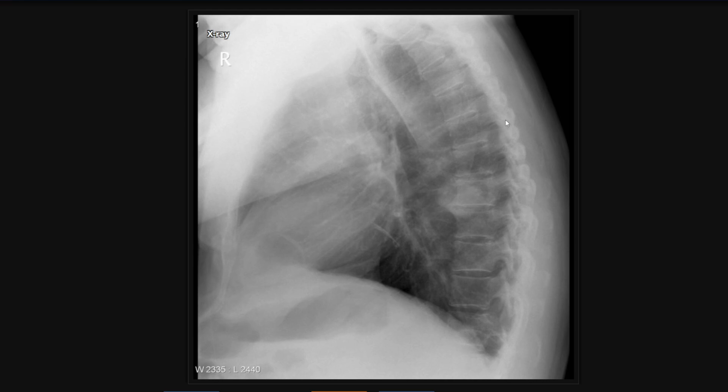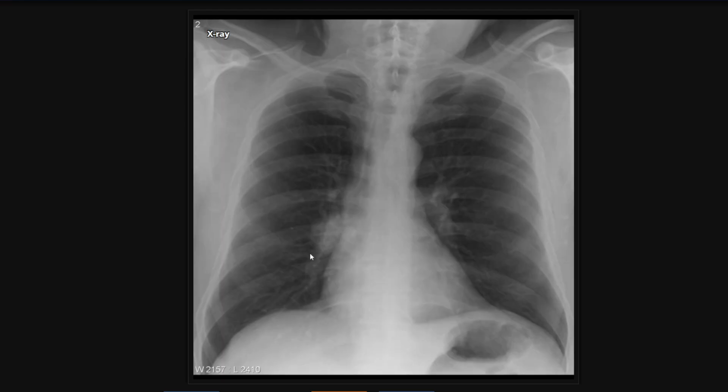If you can imagine the oblique fissure, not a straight line, but an oblique line, obviously the area below it, next to the spine, should be the lower lobe of the right lung field, which is where this big nodule is. So we have a pulmonary nodule present within the right lower lobe and projecting through the right hilum, but without anything affecting the pulmonary blood vessels. This is known as a hilum overlay sign, suggestive that this mass is either anterior or posterior to the hilum.